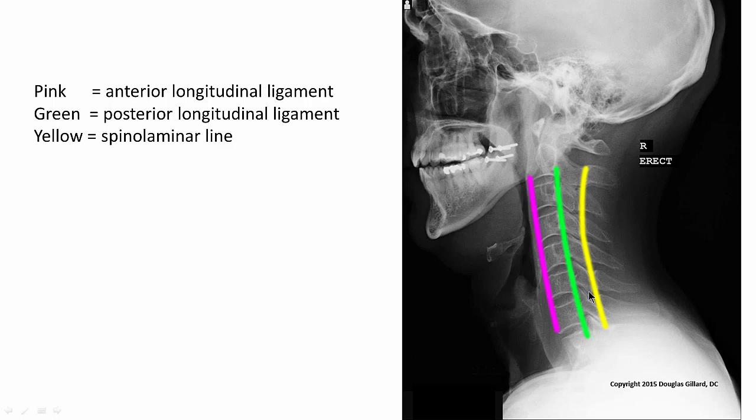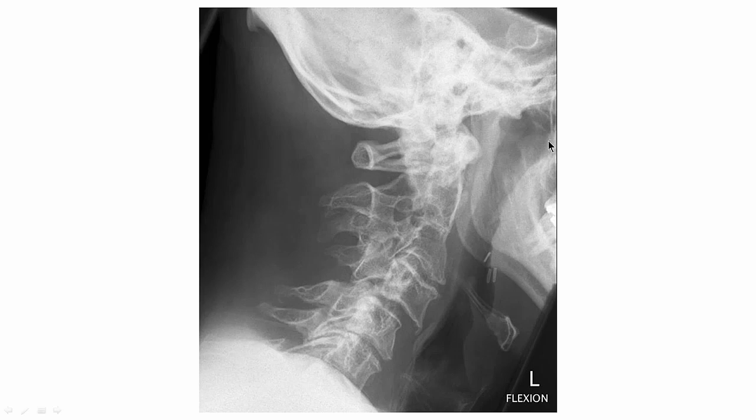So those need to be in place, because what if your patient comes in, here's your 4 o'clock patient. Okay, so what do you see here? I'll give you a second. There's 2 weird things on this. All right, notice this is even in a flexion view, so this is trying to magnify any slip. Well, let's check out those lines.